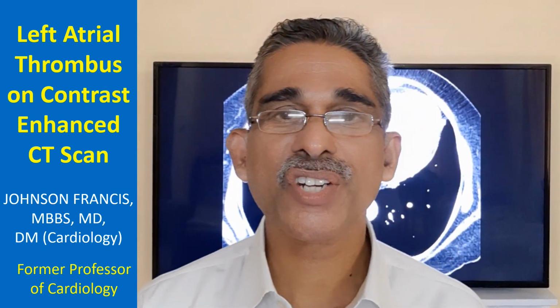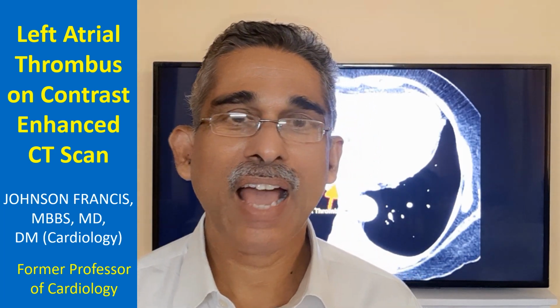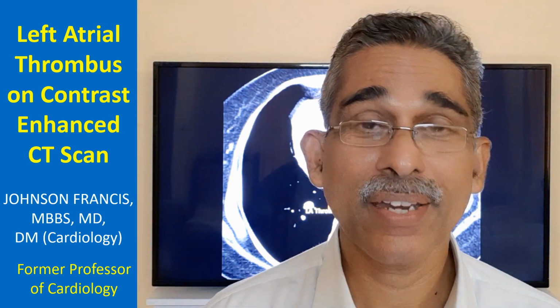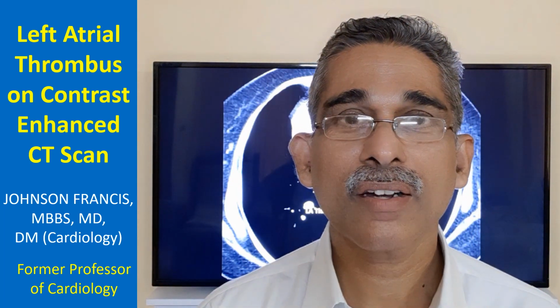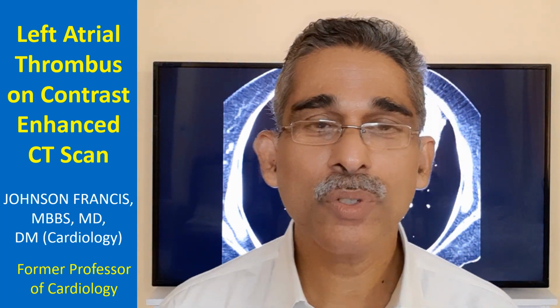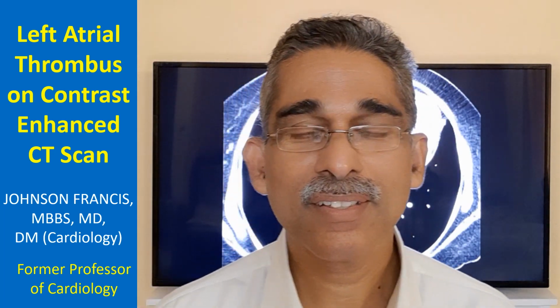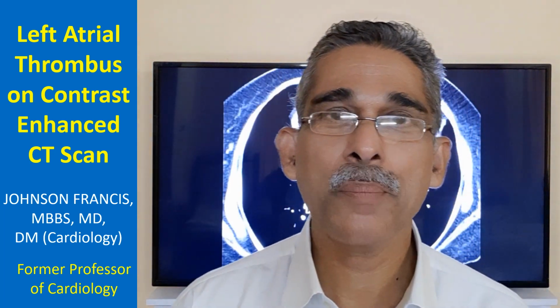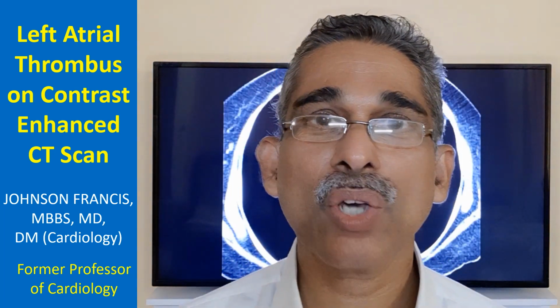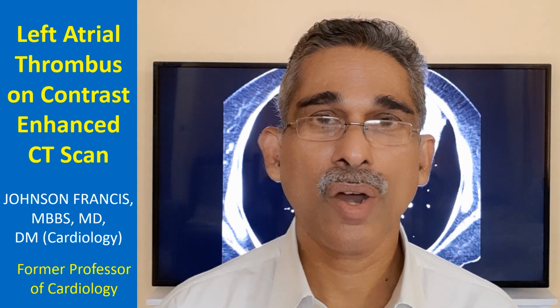Now I am going to demonstrate thrombus in the left atrium on contrast enhanced CT scan. But left atrial thrombus or any intracardiac thrombus for that matter on CT scan is usually an incidental finding, because we seldom do a contrast enhanced CT just for demonstration of a thrombus, because most of the thrombi are usually picked up by routine transthoracic echocardiography, and sometimes by transesophageal echocardiography.